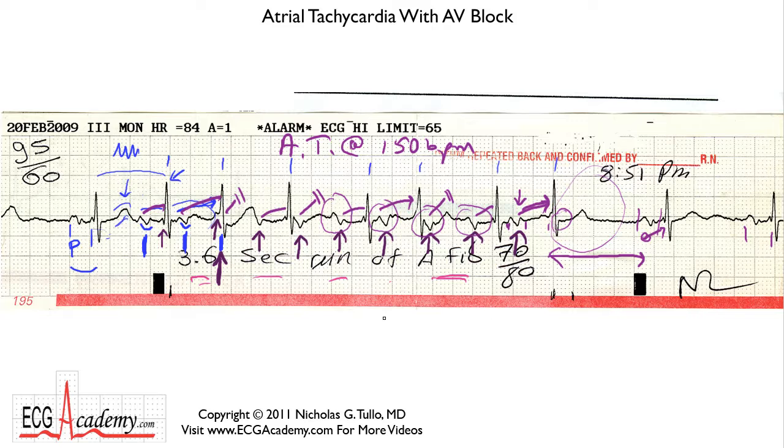Becoming an ECG expert means you have to carefully analyze these strips for the subtle details, but now that I've shown you what it looks like, and after you practice a few times, those little details will pop right off the page. You'll be able to pick those up right away.